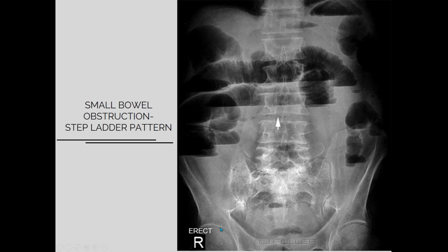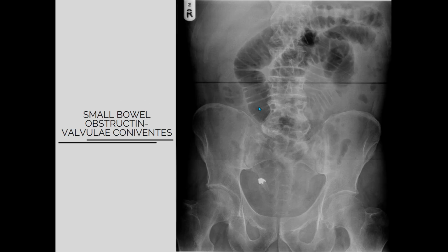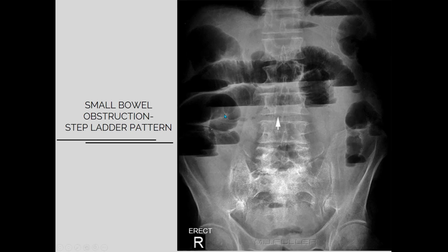Remember, in your exam we are just hiding these markers, okay? So you cannot rely on these markers. You have to just rely on your findings. According to the findings, you have to decide whether this is supine x-ray or the erect x-ray. In the previous x-ray, you can see that there was no air fluid level, okay? Because of that, you can say that this is abdominal x-ray plain AP supine, okay? This is supine picture, while here this is AP picture, but that is erect. So you have to mention always whether this is supine or erect.